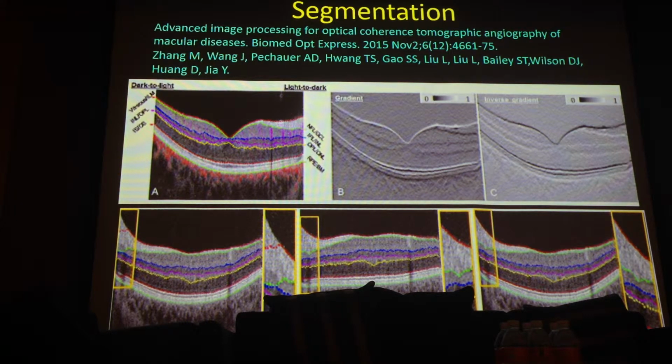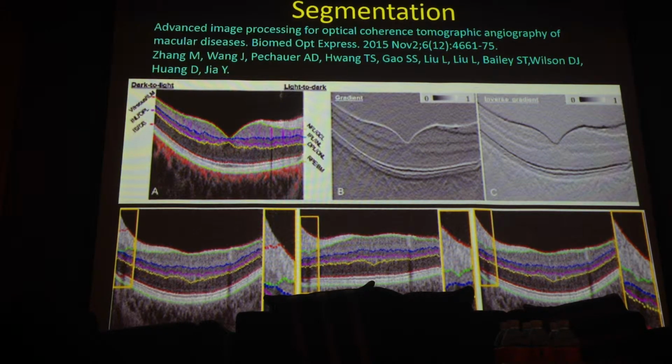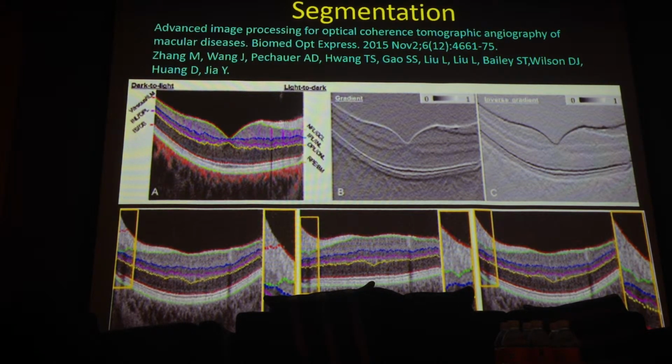With these images, they use the segmentation software, and they propose at this time a semi-automatic correction of the software. You can see this box. In this box, we have misalignment of the segmentation. With the help of the doctor, we can just put some dots in the right position, and the system will automatically correct the segmentation on this part.